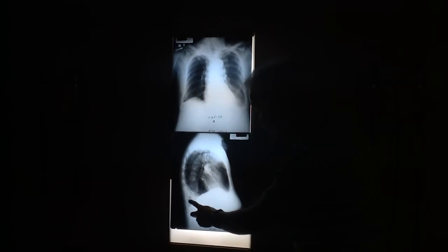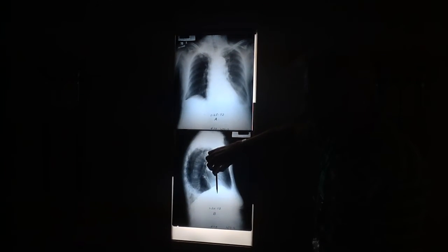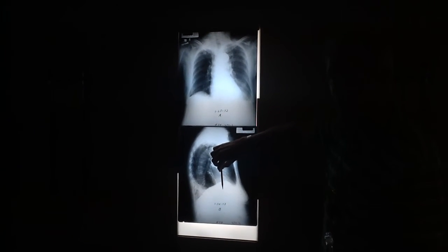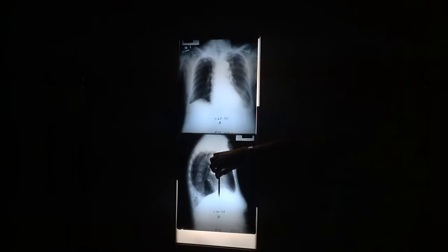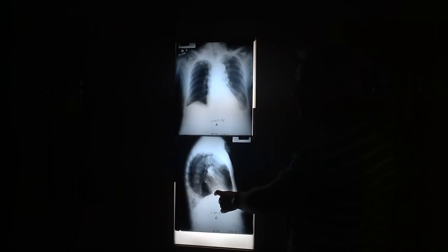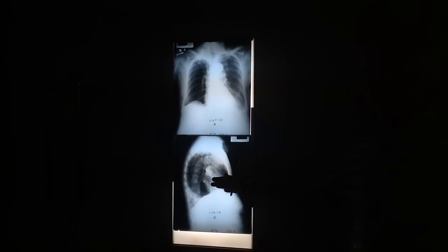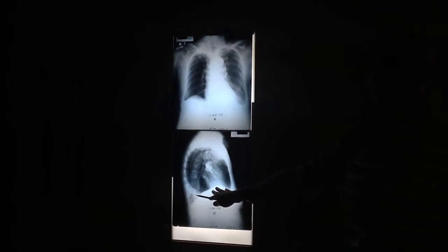And there's no left hemidiaphragm visible because this is doing a meniscus right up against the heart also, right behind the heart. So there's fluid all the way above the posterior left hemidiaphragm, and the heart's above the anterior part of it. So the whole hemidiaphragm is being silhouetted on the lateral view. That's why the only one we can see is the right hemidiaphragm.